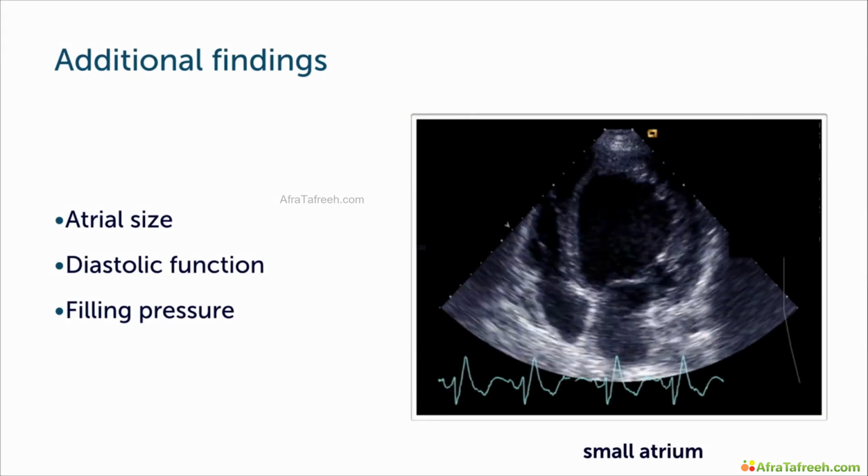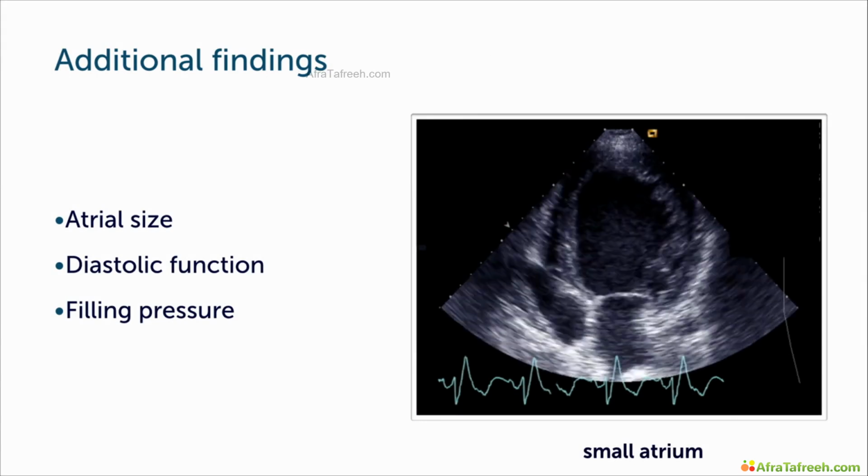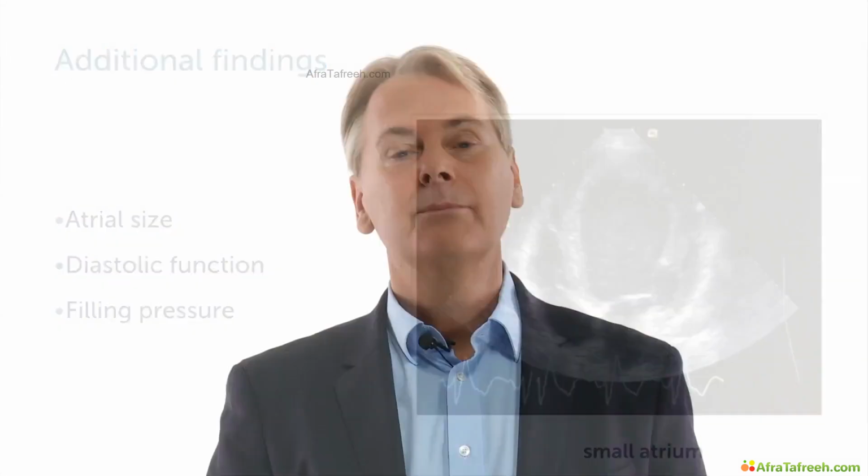Aside from left ventricular function and size, there are other things that you should study in these patients. And this includes left atrial size, diastolic function, because there we'll be assessing filling pressures, and the right ventricle, as you will see later. But now let's focus on the left atrium and look at how we assess the left atrium in such patients.